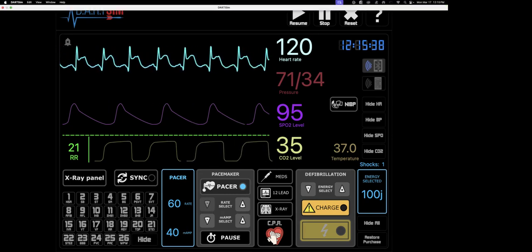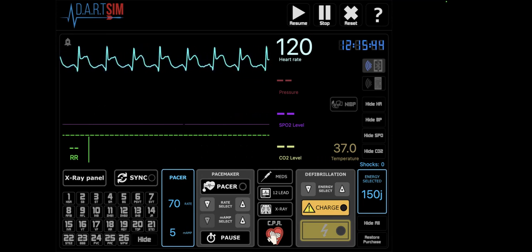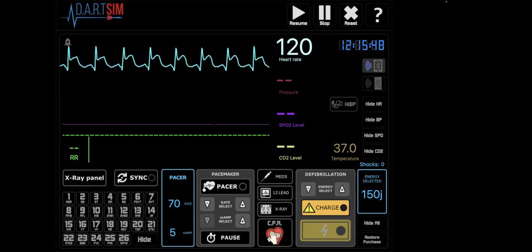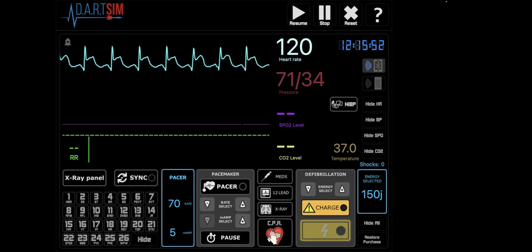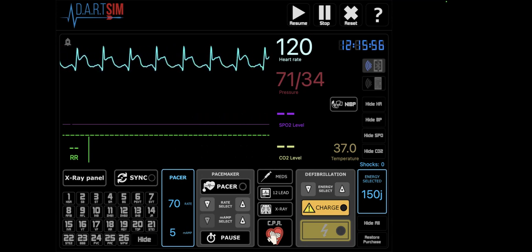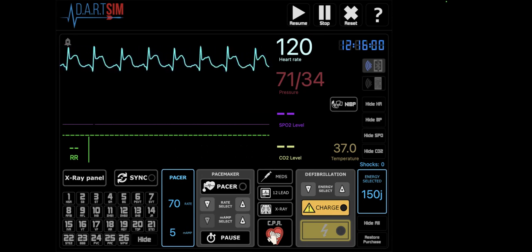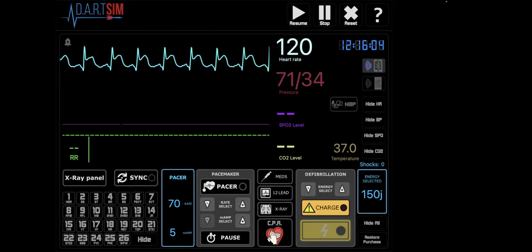Sorry, let me just reset this. There, let's check a blood pressure now. And I would like to have a 12-lead, because, oh, sorry, I'm not sure why the blood pressure is not resetting. Let's try it again. But I want to do a 12 lead.